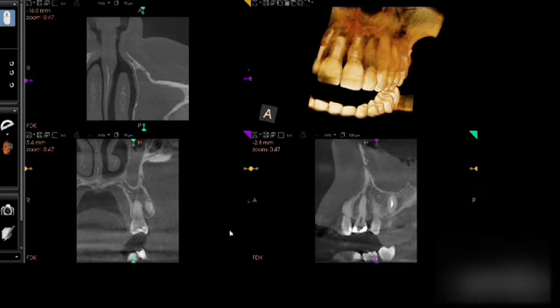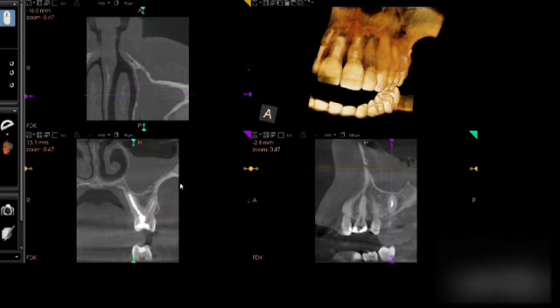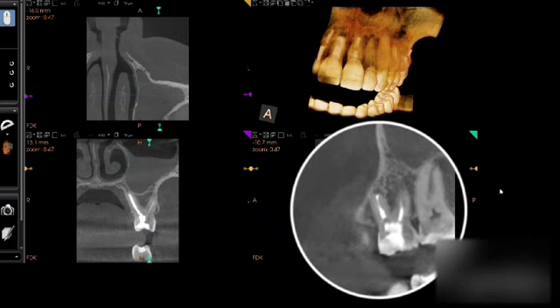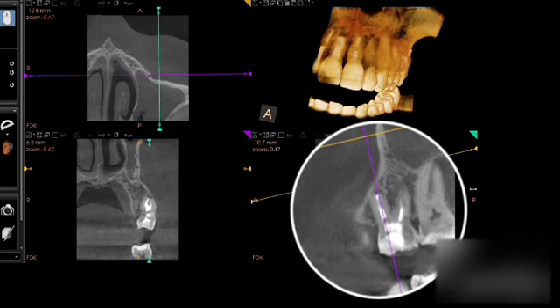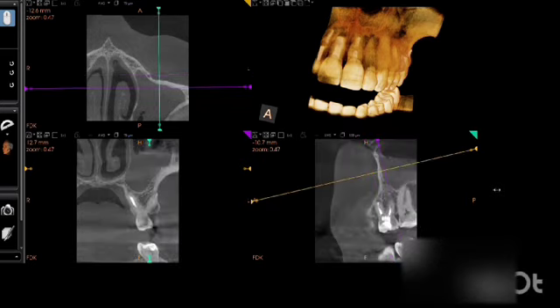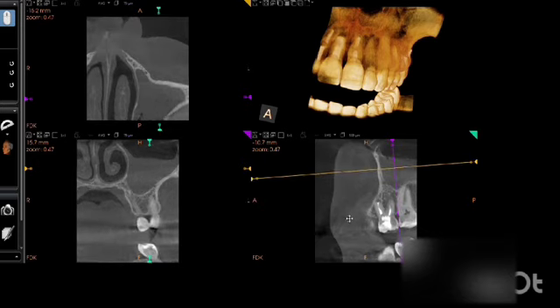Even here we can see this is tooth 2-5, and then if I move here, the endodontically treated tooth 2-6 exhibited a healing post-treatment appearance, with the mesiobuccal root exhibiting a healing post-treatment appearance with no significant pathology. But we found something interesting within the maxillary sinus.